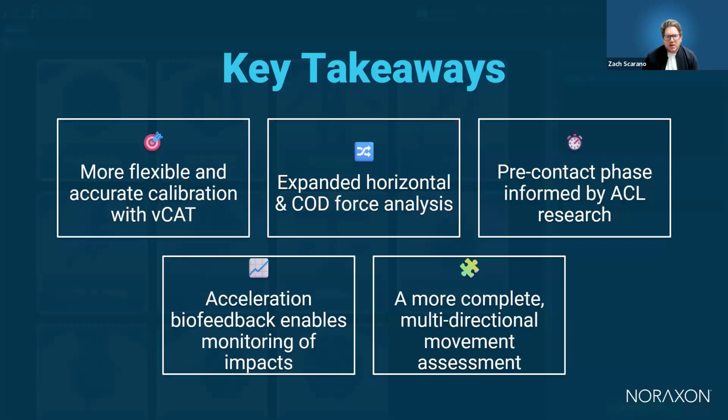And second, the horizontal and change of direction force analysis expands what you can measure beyond those vertical tasks. With automatic shear force metrics built in, you can directly evaluate braking, propulsion, and directional loading during cutting, accelerations, decelerations, and return to sport movements, all within MR4 directly.